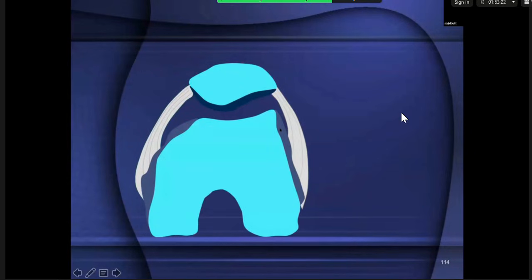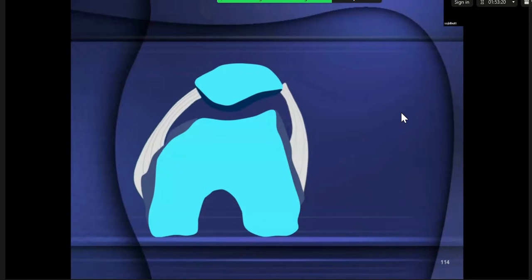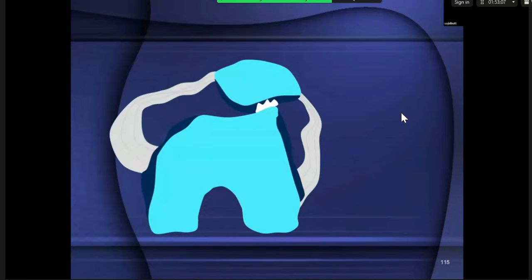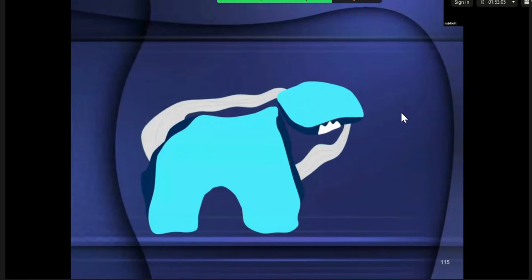But what happens is that this constant lateral pull pulls the patella towards the lateral side. The patella hits the front of the lateral trochlear surface. You get bone bruising, chondromalacia at the adjacent, striking surfaces. You've got complete subluxation with rupture and stretching of the medial supporting structures.